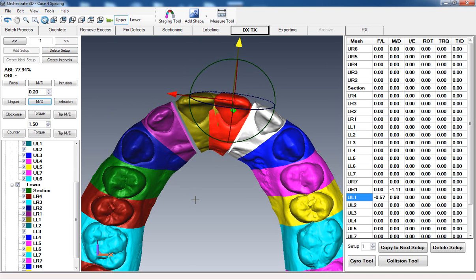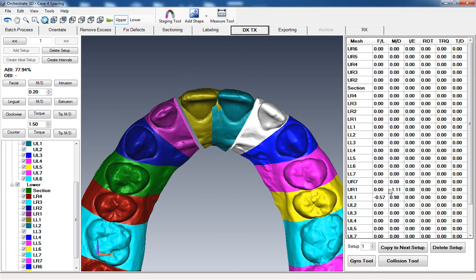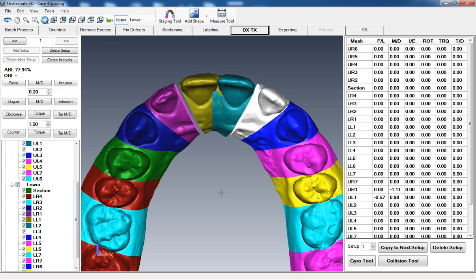Okay, so that's just the slight deviation in terms of how we treat the case. So essentially, not exactly even between the two, but off by a tenth of a millimeter, which is very small. Now we're just going to work our way around the case.